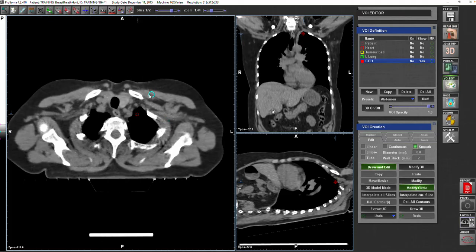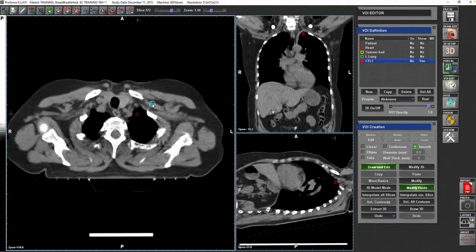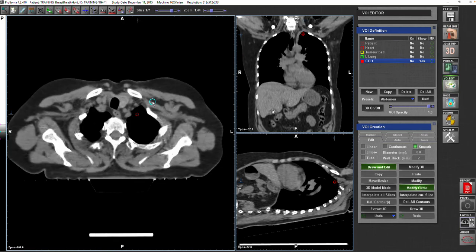I also need you to familiarize yourself with the pectoralis major muscle. I don't think any one of us will not know that this is the pectoralis major, but this is not the point I want to show you. I want to show you this bit of tissue here. Don't forget that the pectoralis major has a clavicular head. So sometimes when you draw level 3, you look at this and you don't know what exactly it is.